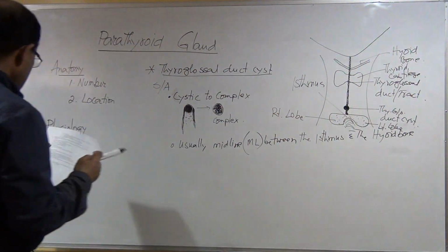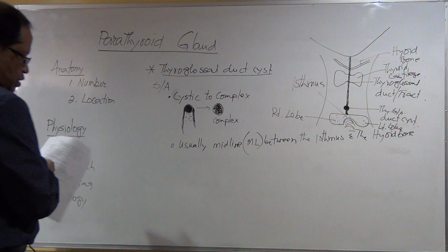Now I will discuss the lymph nodes in the neck.